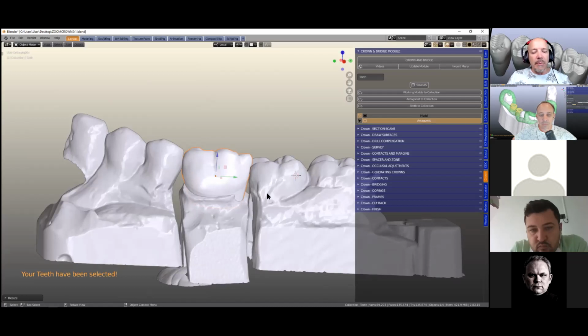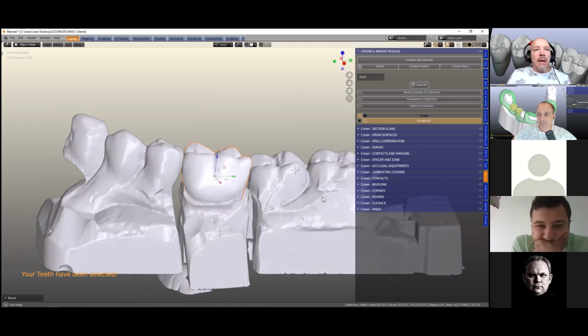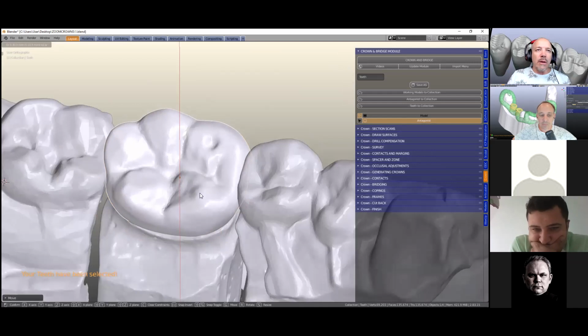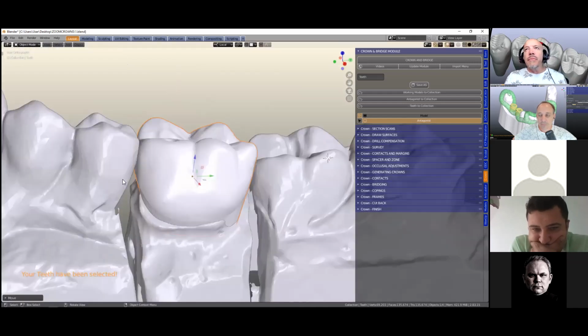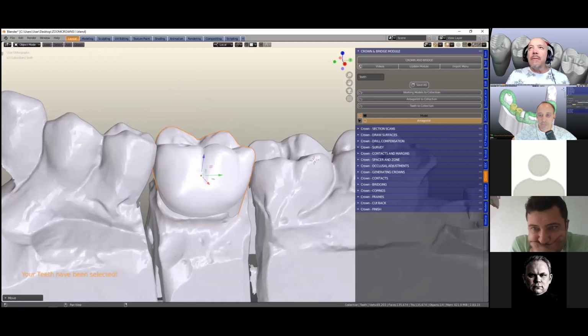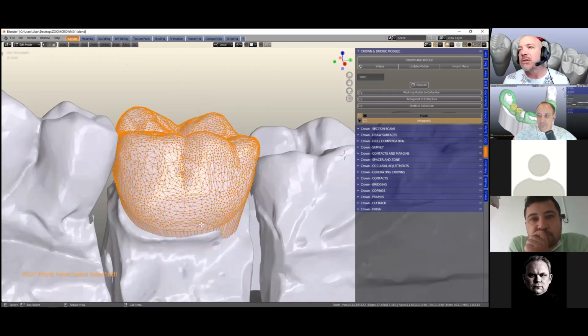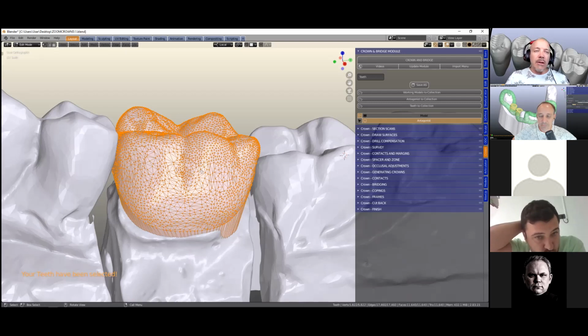It doesn't have to fit 100% because of course the tooth has to change. I can see the tooth is quite far away from the margin here, so I'll reach a compromise, something like that. So we're done and dusted with this menu. No, we're not. We still have to put this into the tooth collection, and that remeshes the tooth, because we all have different tooth libraries with different meshes, and we want to standardize the mesh. So this is what it does. It's going to remesh your tooth library.